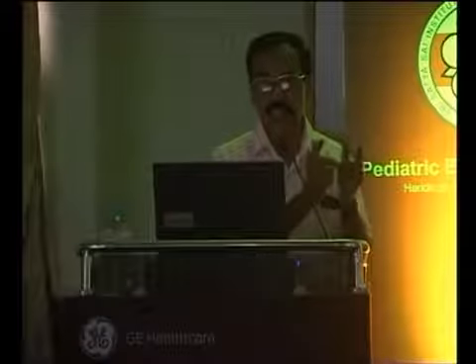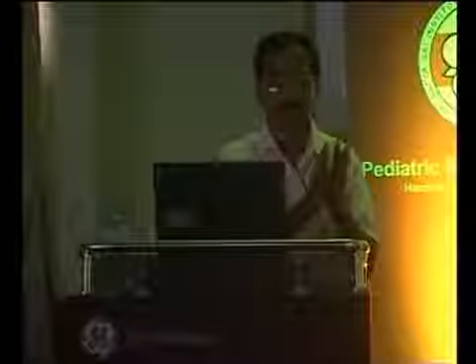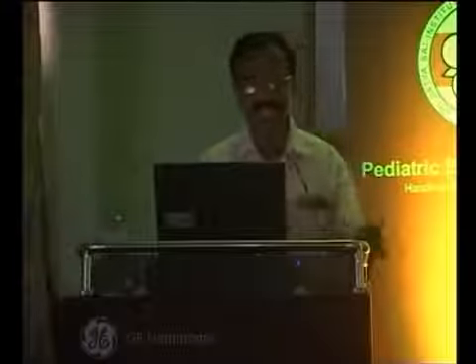You will not be able to generate two circles together. Especially those of us who do fetal echo, you can imagine and create anything you want. That is why nowadays we try to go by standard views and standard pictures so that another person who sees the picture can interpret. But if by mistake you generate two circles together, still go for the standard views and look at their relation, and if you can convince yourself of the aorta and pulmonary artery on the right side, you may not have to commit that this is this or that. And I agree, it is only imaging, you can generate a lot of confusion.